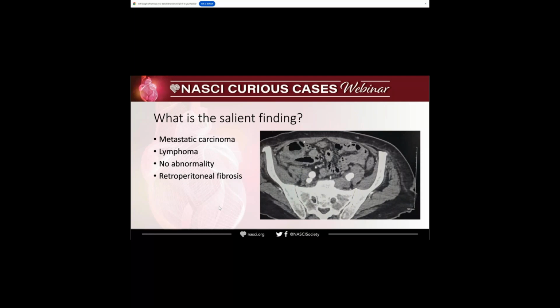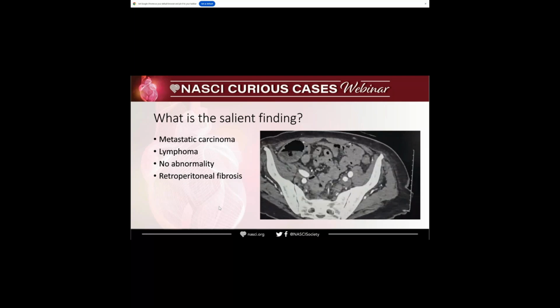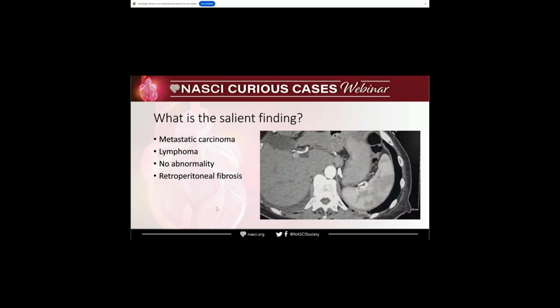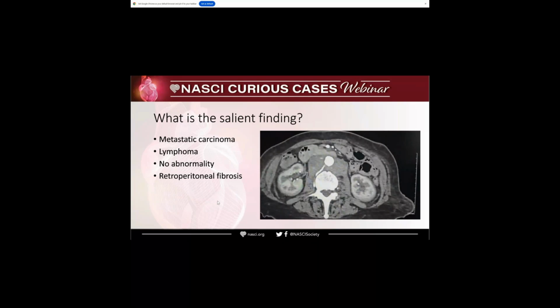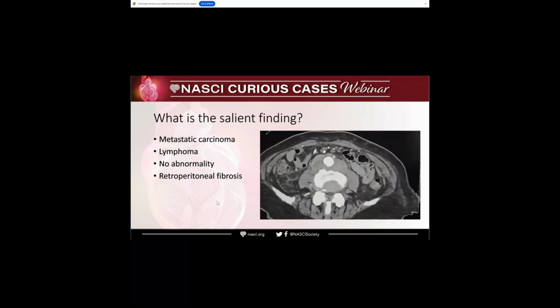What would make it easier to favor lymphoma versus retroperitoneal fibrosis? A biopsy? But you don't have a biopsy yet. You see the imaging, and for example, you're the on-call physician at 3 a.m., you need to decide: is it lymphoma or is it retroperitoneal fibrosis? Are there any older studies? No. So I don't know. Okay, now I'm looking at the kidneys.